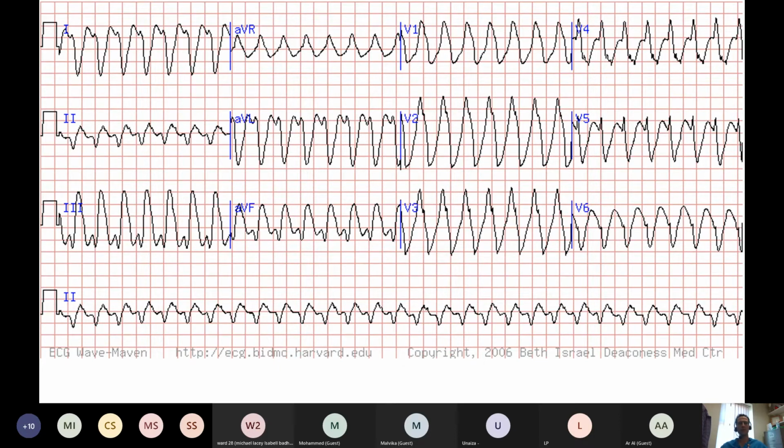Nobody? So everybody hold your right arm up in the air. That is the direction in which AVR is looking at the heart. So AVR over here is positive. Can you see that there is an upwards deflection here? That means that, hold your right arm up in the air again, the electrical signal is going up at your right arm. How is it, if it's starting in the atrium, that the electrical signal is predominantly moving upwards? It shouldn't be possible, and generally speaking, it isn't.